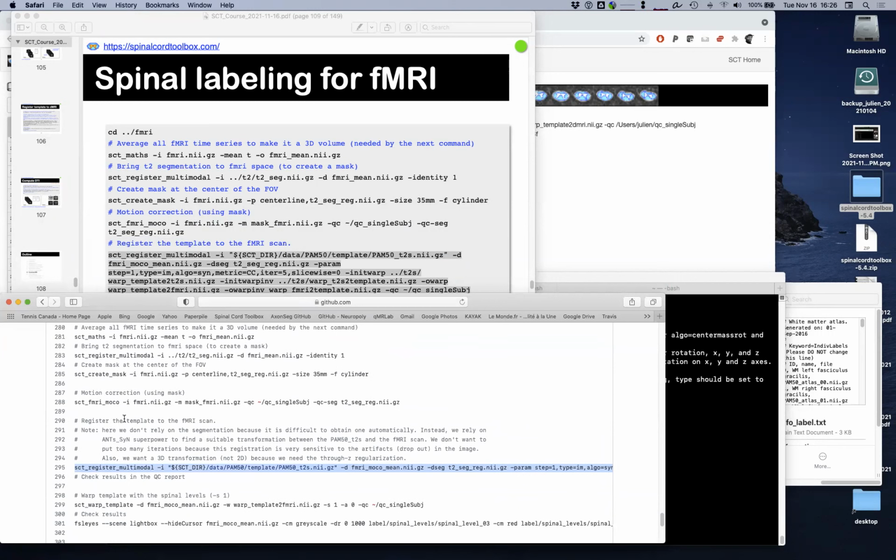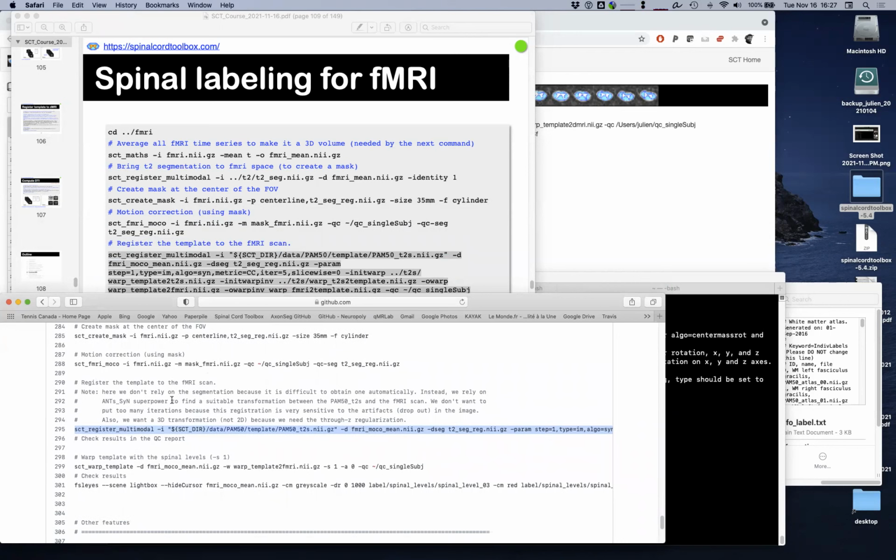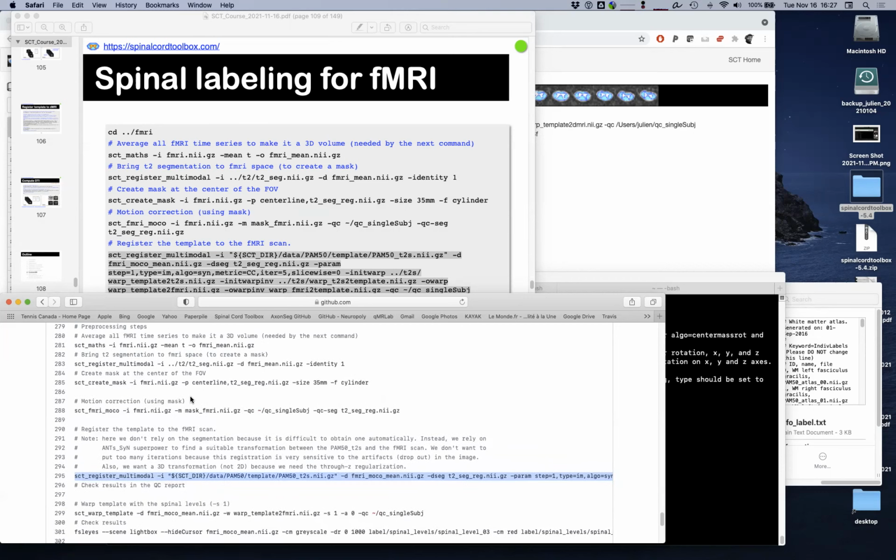Julian, it's actually the version problem. I posted on the forum and Josh Newton responded back. Oh, and now it works. The -O warp inf was introduced in version 5.4. So once I remove that, it now works. And it generates a different output file name, so I just had to rename that.